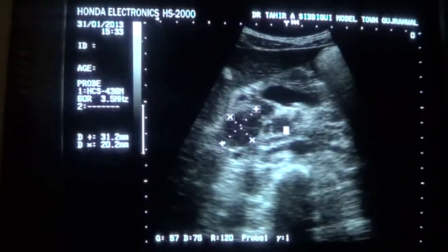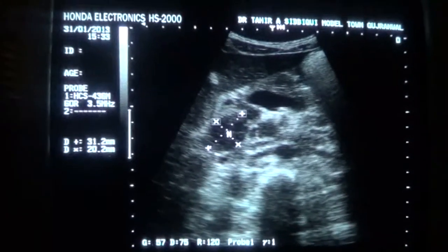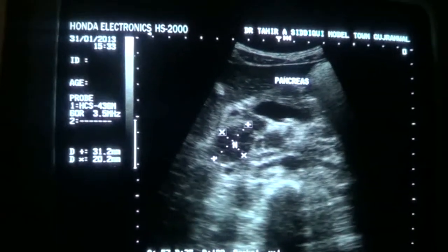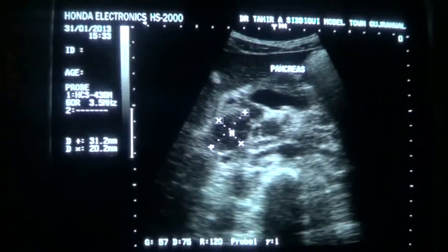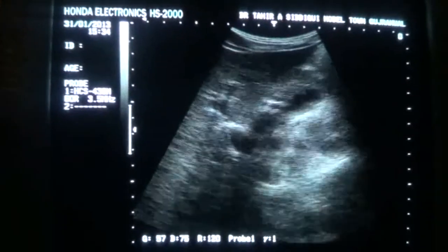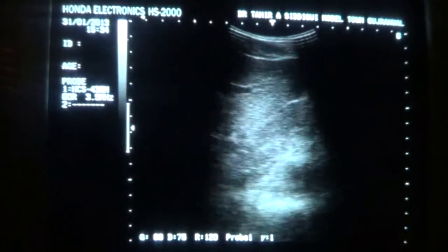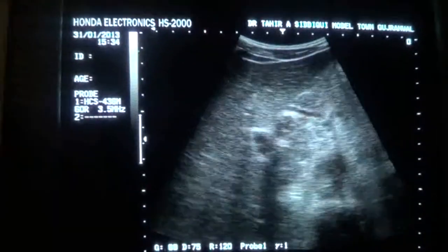So there is a lymph node in this location as well. So this is a case study regarding paravertebral adenopathy, with differentials of, in our area, TB infection or granulomatous disorder being considered as differential number 1.